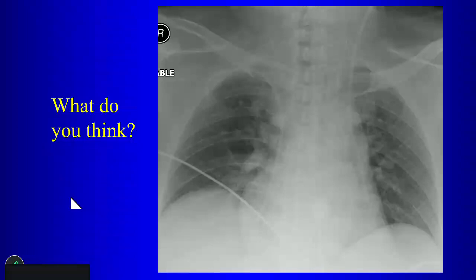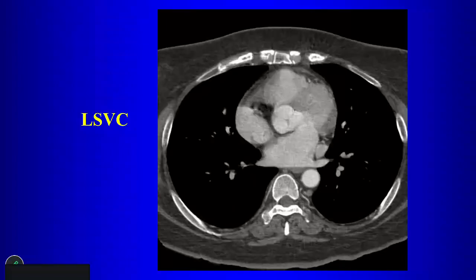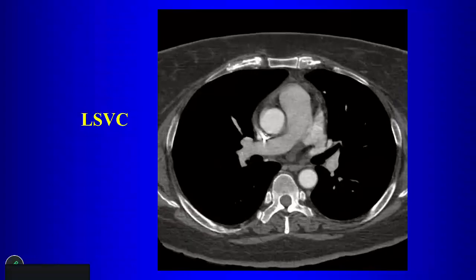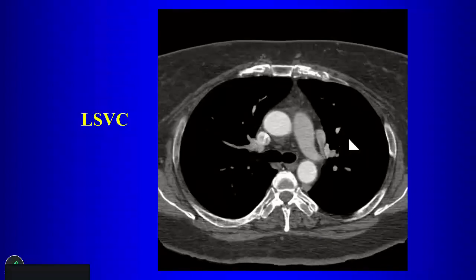Okay, so for this particular case, that catheter coming down the left side, what's the answer? You don't see the catheter, but of course you always look at prior imaging on the patient to look at their anatomy. Yeah, so there's a persistent left superior vena cava.